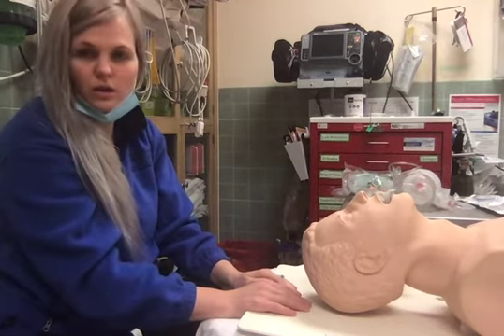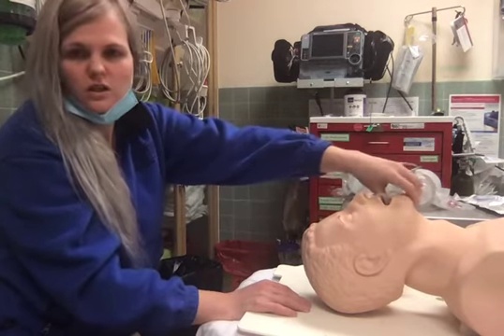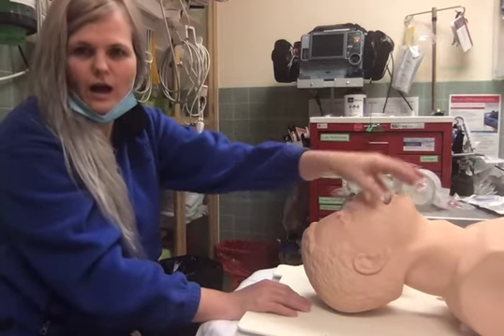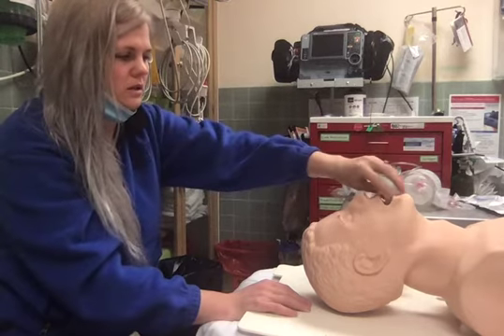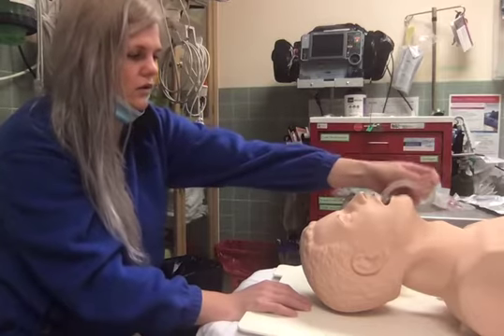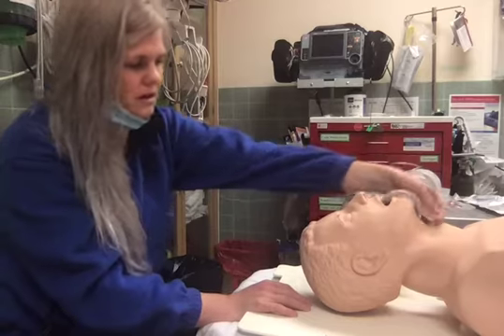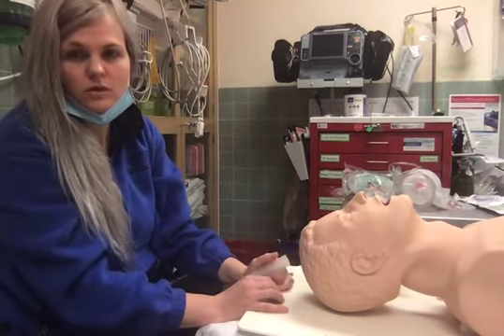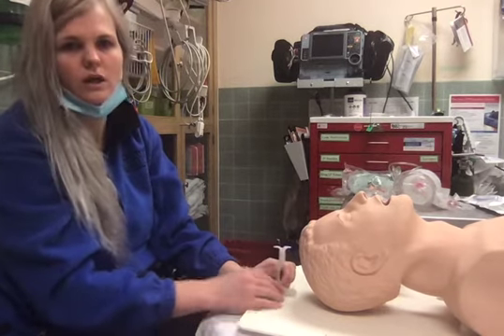Also, when we are getting ready to RSI a patient, I will utilize this so that when I'm pre-oxygenating them, I feel like I just get a better track to add some pressure to optimize their oxygenation prior to intubation. To remove, if you get that far, you're just going to spin that out. We generally don't remove these too many times in the field unless we move to the intubation route. But once these are in, you're just going to leave them in, not move them around too much.